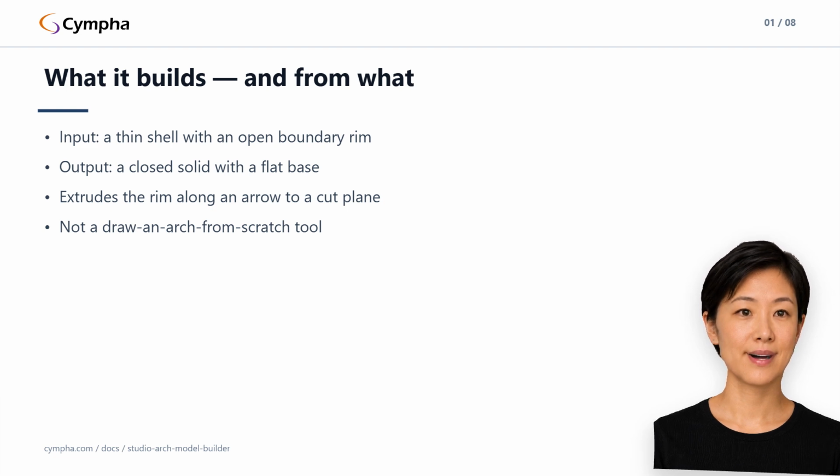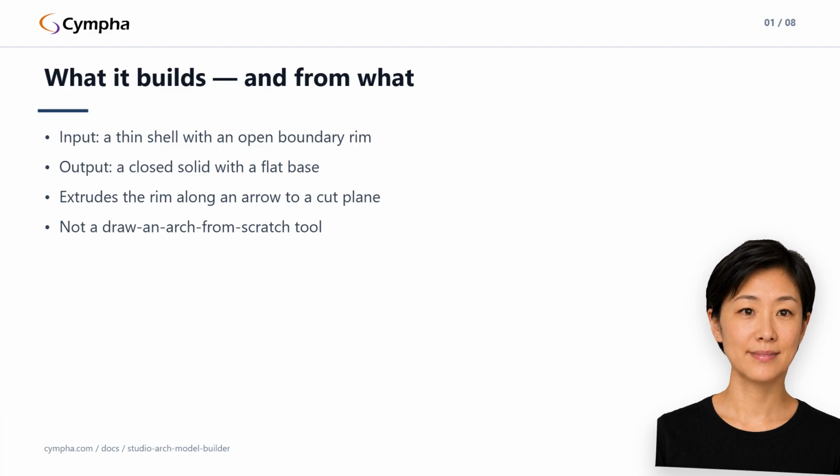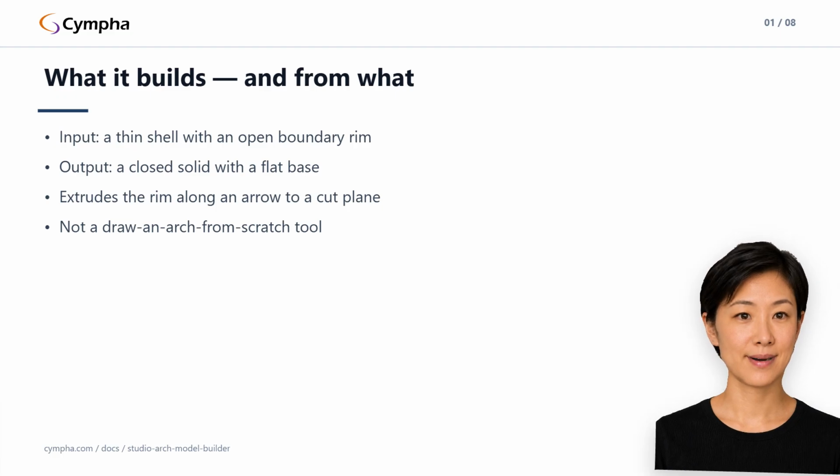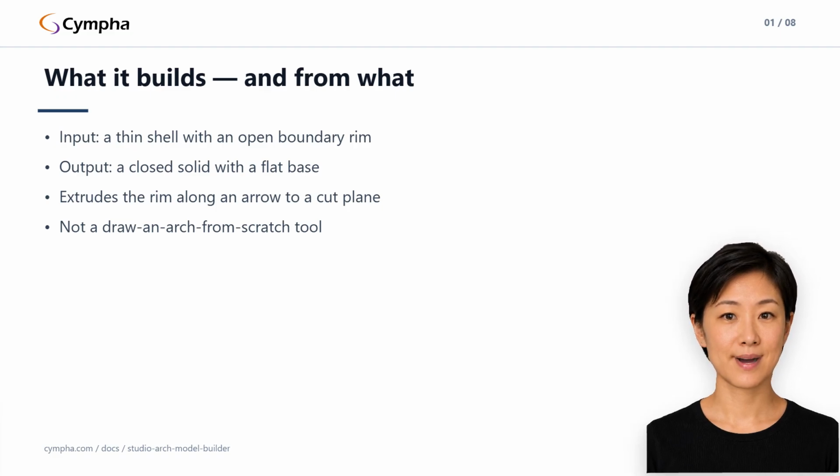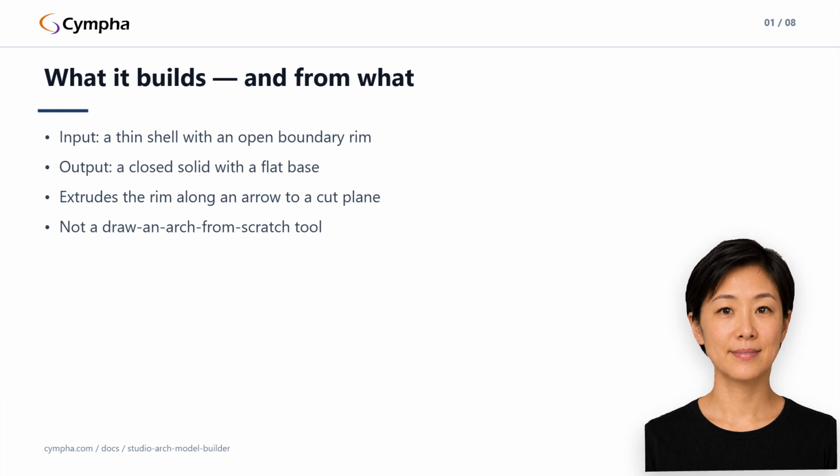And one expectation to set straight: if you came looking for a tool that draws an arch from nothing, laying down a curve and synthesizing tooth shapes along it, that's not what Studio does. The arch curve you may have seen in the CBCT viewer is a different feature, used to drive the panoramic view. Make Dental Model builds a solid from your scan, not from scratch. If you genuinely need a fully synthetic placeholder arch with no scan input, reach out through the contact page. That's a workflow the team can help with directly.